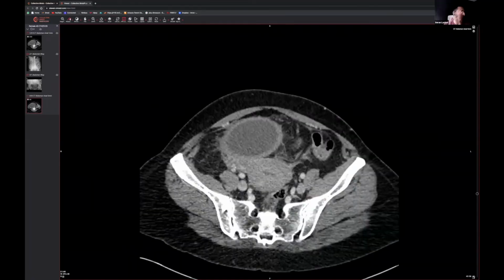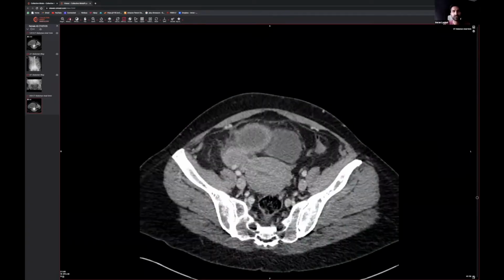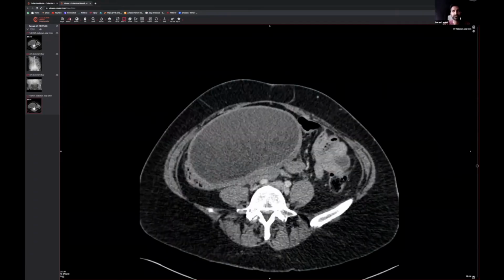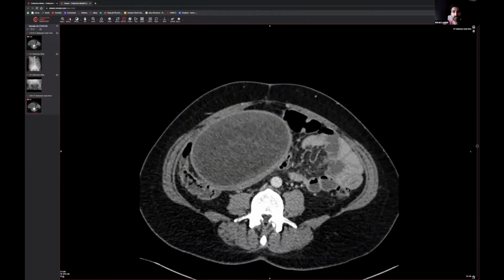So you could say, look, I think it's a teratoma, which you're fine, you may be right, but how do I 100% know that this is not an appendiceal lesion? And the only way to really do that is to go through the bowel, right? So I always say the constants are going to be the descending and the ascending colon on either side. So this is the descending colon. They're pretty much always going to be there. They don't really move.